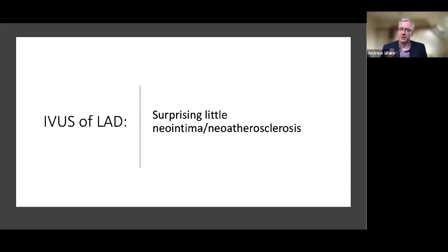Yeah. I mean, what's impossible to predict is where the LAD tapers down. So there's a very good study on this, in that you ask operators how big is the LAD, and you then show them a cross-section near the ostium of LAD, and they're always surprised by how big it is. But the septal branches come off at such a rate that we always underestimate the tapering.